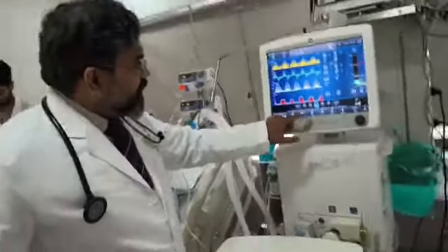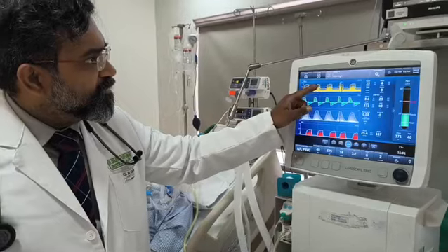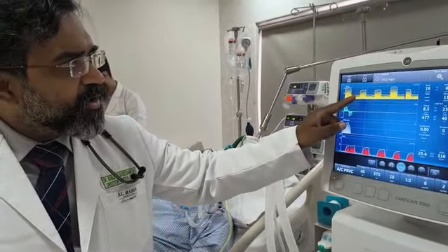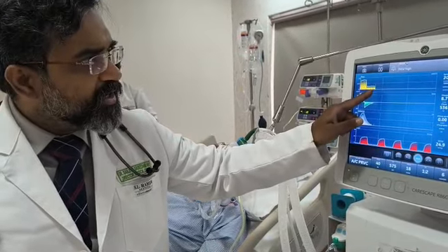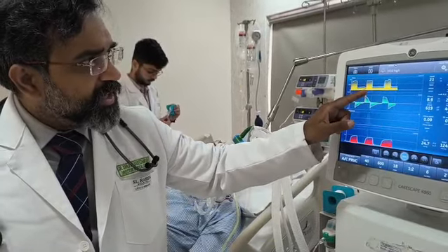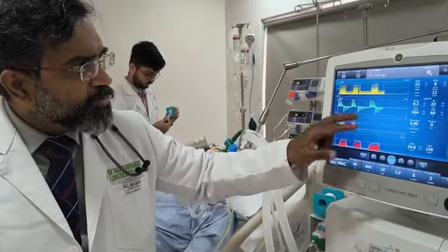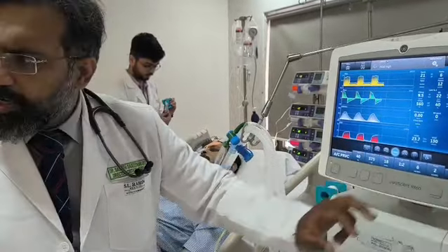So when we come here again, if I increase this tidal volume to say 575, you can see the flow going. See that? It's almost disappearing. In fact, 600 will make it disappear completely. If I make it 600, it will make it disappear completely. Let's see. Almost gone. That's why. But however, we can't keep it at 600.